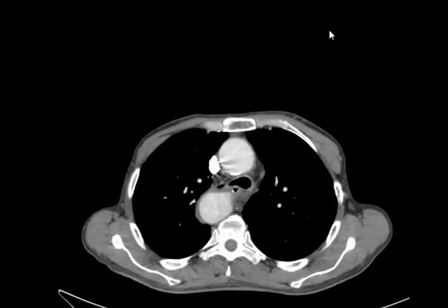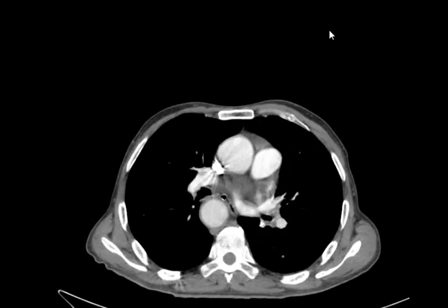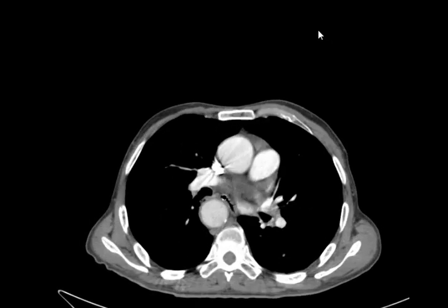See? Maybe this is areas of retained fluid. Maybe. I don't know. Okay? Here looks good. Esophagus. Maybe. Good. Next.